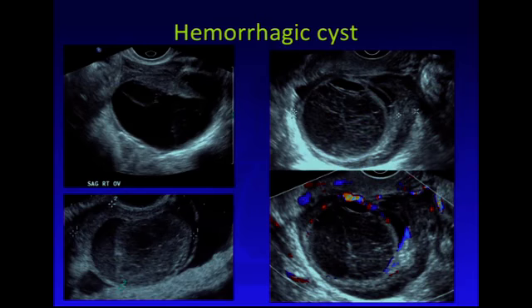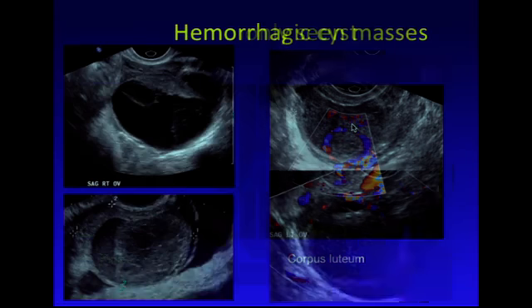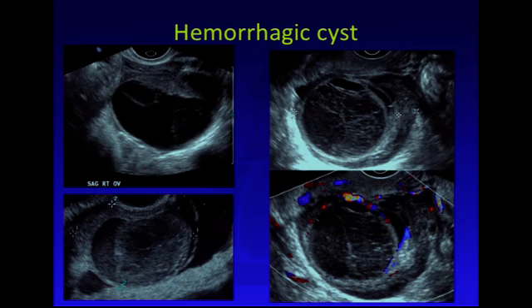These are good examples of hemorrhagic cysts. So basically it's this corpus luteum that fails to involute and kind of grows. And so these are the characteristic appearance of hemorrhagic cysts. The most commonly described is this characteristic lace-like appearance, which is diagnostic of a hemorrhagic cyst. Again, you have to make sure it's a premenopausal woman, of course.